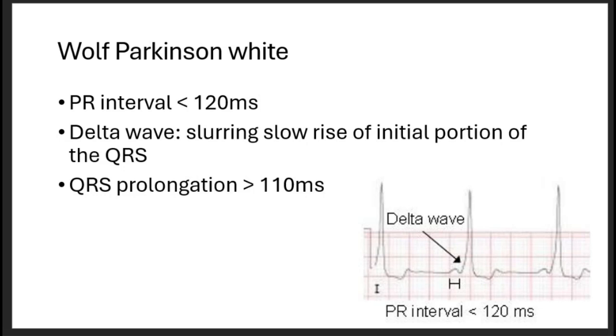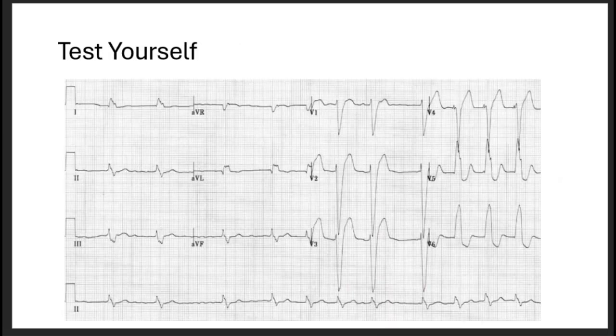Okay, so you can test yourself on this. I'll give you 2 minutes. I don't want you to do the entire ECG. Just think about what is wrong with the QRS complexes here.